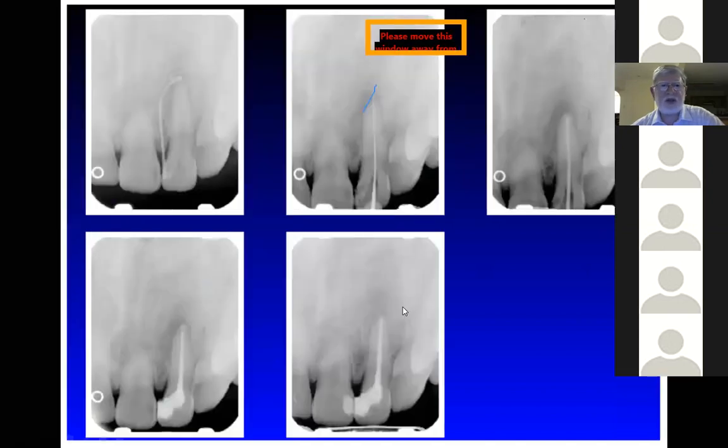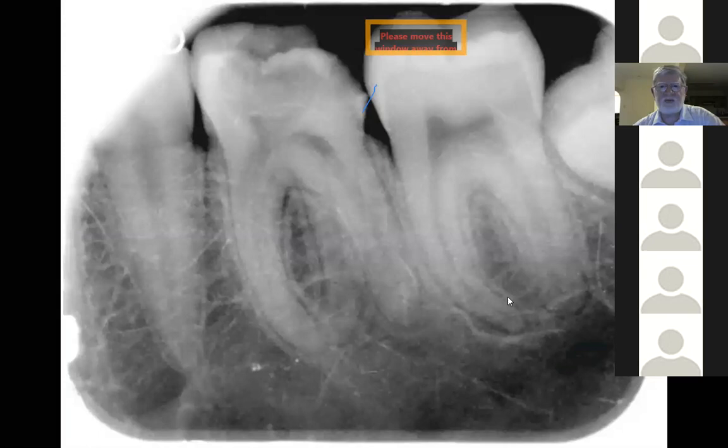And then a similar case, just tracking there. This will have been a GP point going through the sinus, picking up exactly where everything's coming from, when we're cleaning, when we've obturated, and then things have healed very, very nicely for this patient.